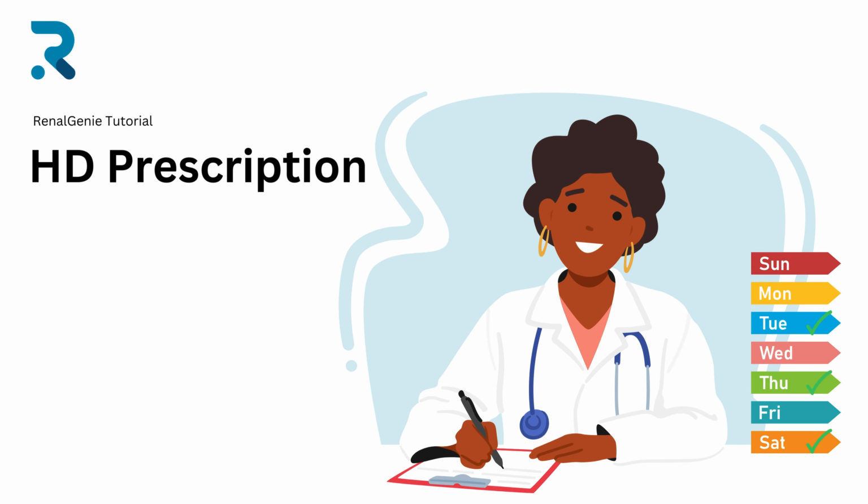In this tutorial, we are going to learn the features related to HD prescription on RenalGenie.